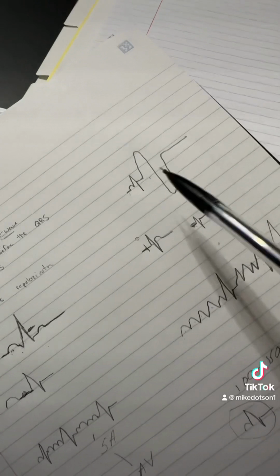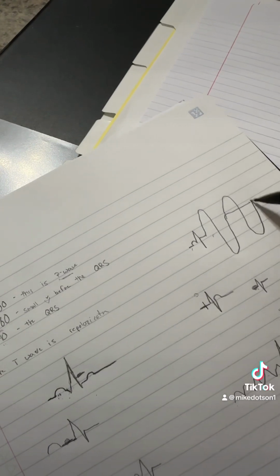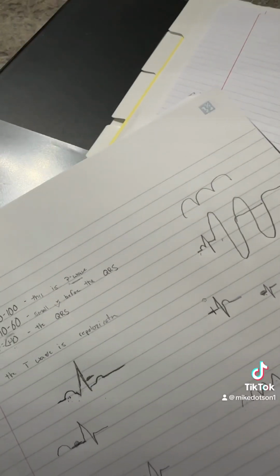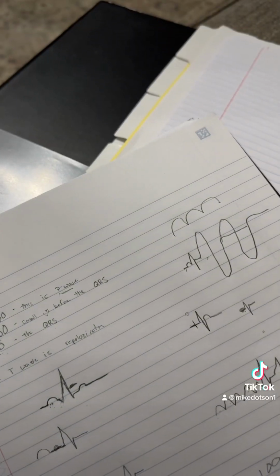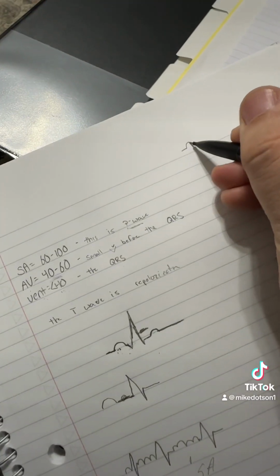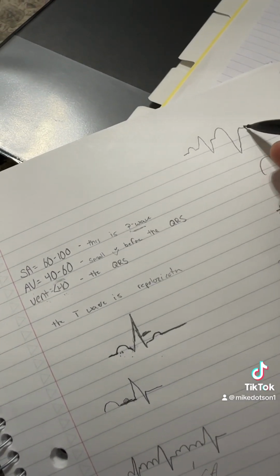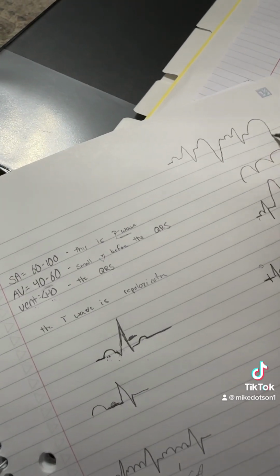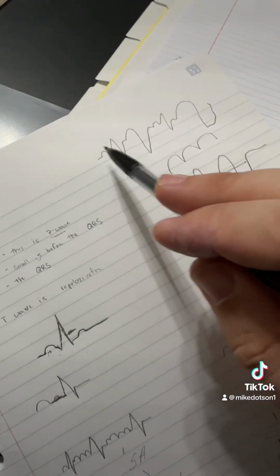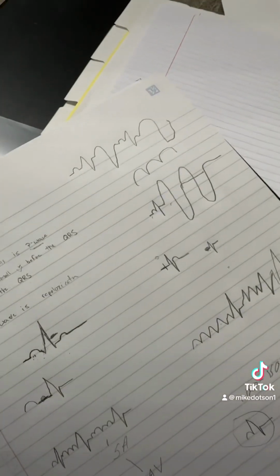And you can see these come in more than one. You'll see them referred to a lot of times as, if you see one and two, those are called couplets. If they come in a run of three, they're triplets. And you can also see what's called ventricular bigeminy or trigeminy. That would be a normal sinus rhythm with a PVC, normal sinus rhythm, PVC. Every second beat would be a PVC. Same thing for trigeminy, it would be every third beat. You would see normal sinus, and then a PVC if it was ventricular trigeminy.